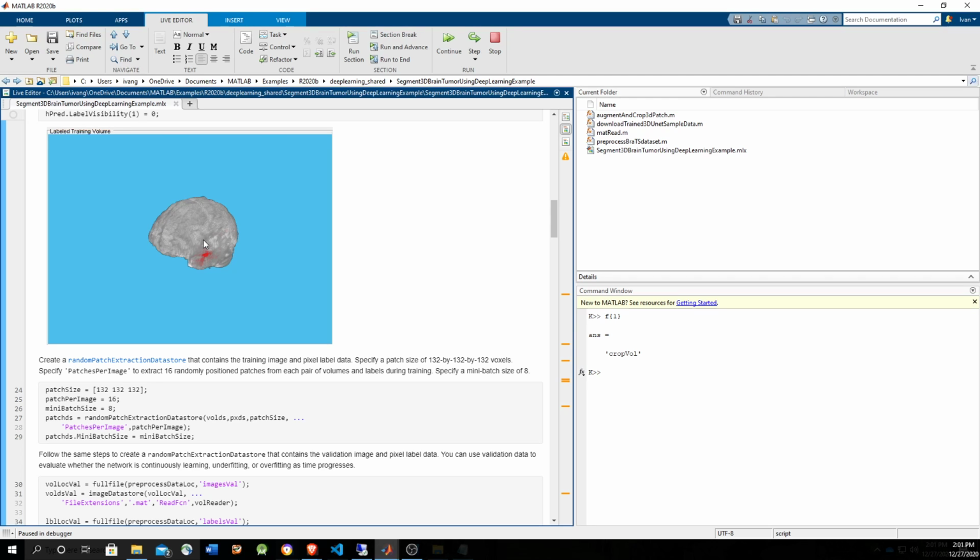So if before, by doing random patch extraction, we multiplied our data to 30,000 samples, now, if we do data augmentation, we can make it look like it is 100,000 data samples. That is one of the purposes of augmentation, which is very useful for computer vision applications and also for 3D volume images, to be able to train the neural network better. But it doesn't only augment the amount of samples, it also makes it more robust.